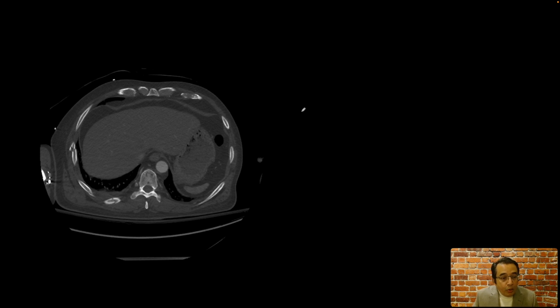This next patient also presented with trauma, and on this single axial image, we find that there are several rib fractures. And so frequently there are multiple ribs that are broken at more than one level. And in this situation, we should raise the suspicion for flail chest.